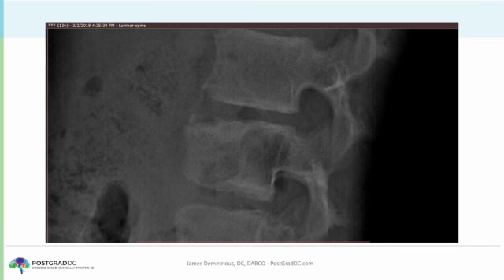This is an x-ray of a 13-year-old patient who presented to my office with acute lower back pain and radicular symptomatology into his right lower extremity along the S1 dermatome all the way to his foot. Onset of pain was insidious 4 weeks earlier with unremitting symptoms. He denied any bladder, bowel, or weakness issues. He denied any trauma or recent illnesses.